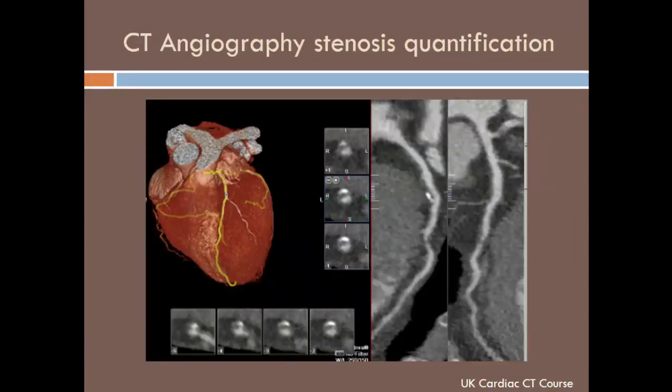Techniques like CT angiography allow us to look at the lumen of the artery and the plaque along the 360 degrees of the vessel wall. So all along the wall we can see the plaque distribution, and then we can estimate the degree of stenosis, just like we can do on IVUS in a similar manner. So in this example here, you can see the plaque itself. So you have calcium in the plaque, you have the soft element in the plaque. So this is a mixed plaque, and you can see the lumen filled with contrast. And you can see this is an eccentric plaque.